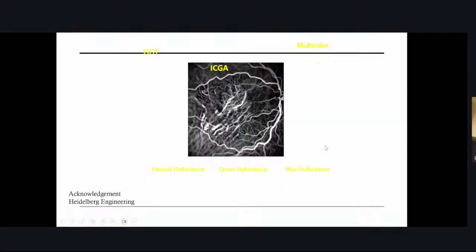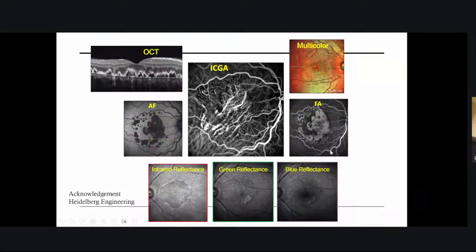As you know, as retinologists, we are really blessed with many types of retinal imaging that can give us information of our retina in various different ways. So you can see here ICGA, OCT, autofluorescence, fundus fluorescein, and multicolor imaging, etc.